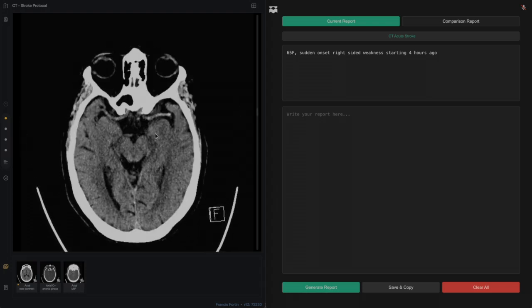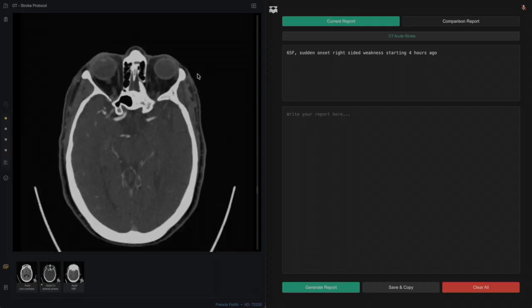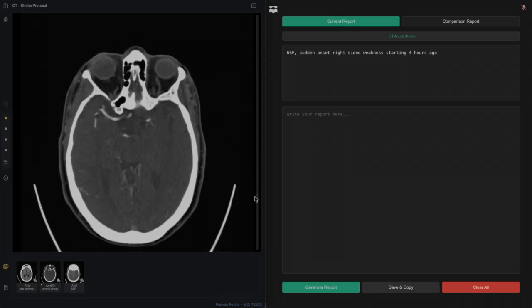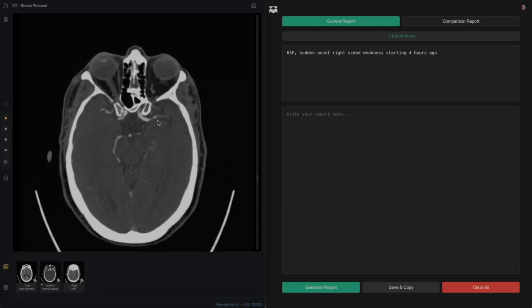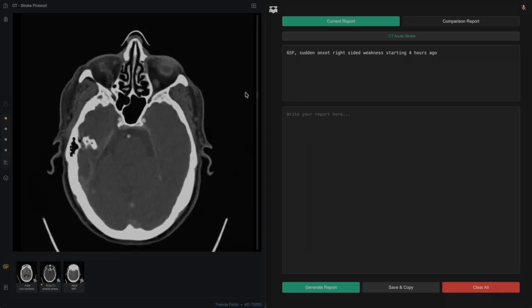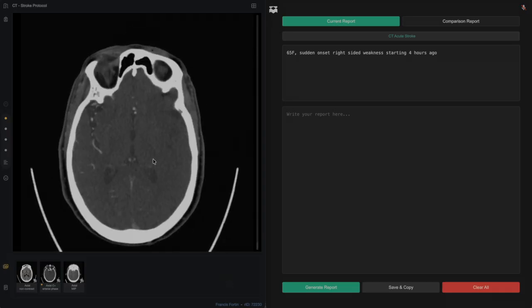So now moving across to look at the angiographic images, when we're looking at the left MCA compared to the right MCA, in the left MCA we get the impression of a filling defect starting around here and filling the rest of the M1 segment. So part of the M1 segment here is still opacifying with contrast, but a big chunk of it isn't. And that thrombus, or that filling defect, can be seen extending into some of these M2 branches. And as we scroll up to a higher slice, we can see there's just no filling of vessels here, almost anywhere within that MCA segment.